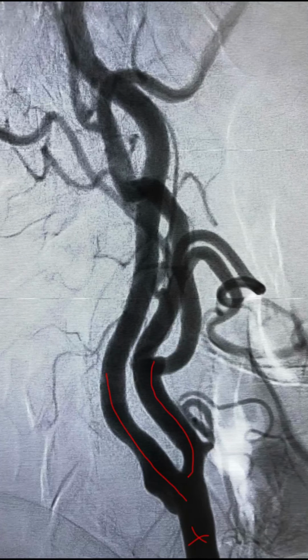So how do you identify which is external carotid and which is internal carotid? Siphon, sir. Carotid siphon. You can trace it up. And second, the internal carotid artery doesn't have any branches in the cervical region, whereas the external carotid has a lot of branches. See, there are a lot of branches from the external carotid. This is important because if there is a tight stenosis here, sometimes, if you are not very careful, you can mistake an external carotid for an internal carotid.